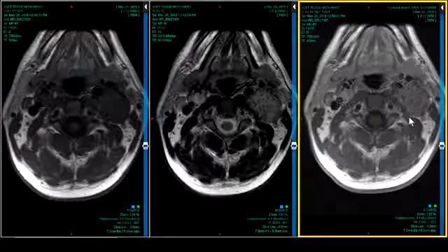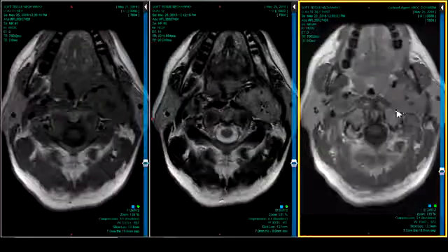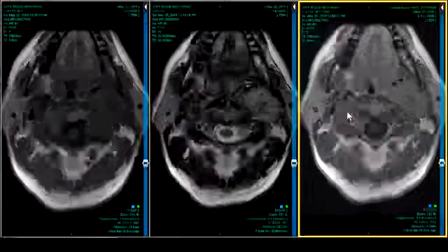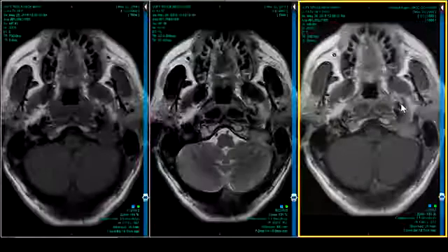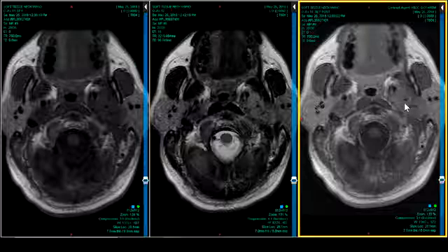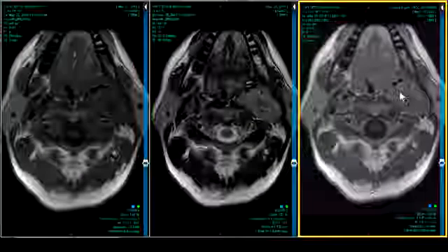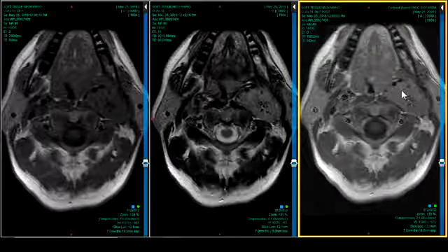And then you have this one, and then you have this one, right? So what are these? If that's a Glomus jugulare, what is this, and what is this? And there's a couple ways. Are they the same, or can you tell a difference? Well, next brother in line is the Glomus vagale, okay? So how do you say, is it a vagale or is it not? Well, Dr. Pomerantz already pointed out, see how the vessels are pushed forward, okay? And Glomus vagale is described, if you read about it, as being 2 centimeters below the skull base, right?